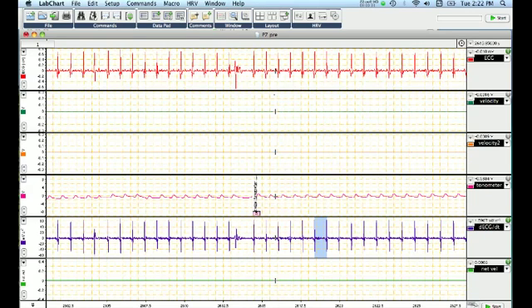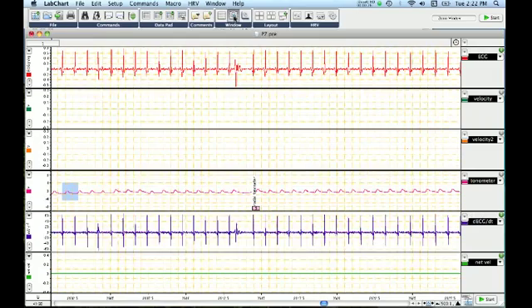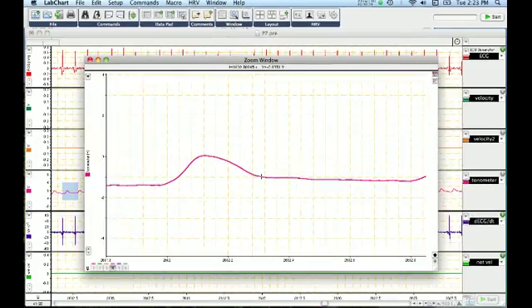Alright, this next tutorial is how you take your pulse pressures that you've found in your chart file and convert them into real pulse pressures. If you notice here, all your tonometer values with the little handheld probe are in volts. What you need to do is convert this volt. In this case, the spike, well, we'll look at one of these values. Clicking on the zoom feature.